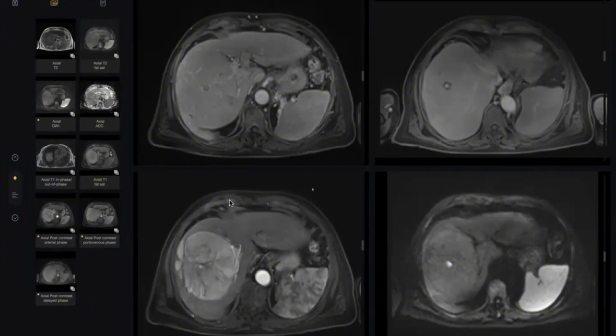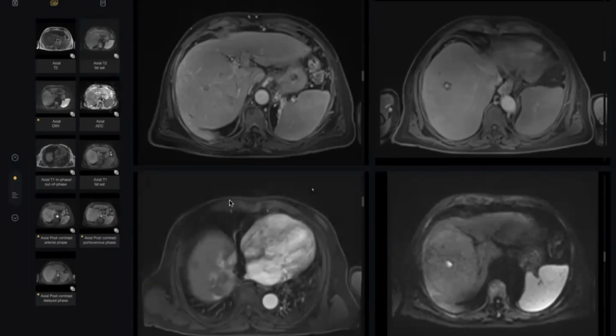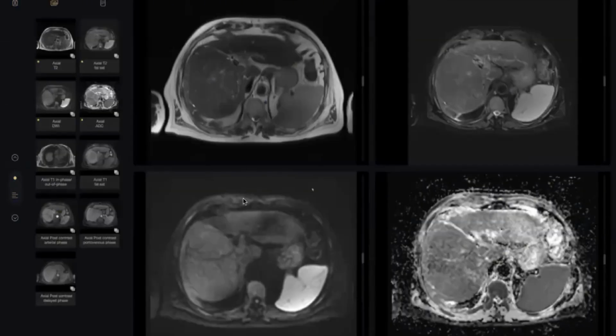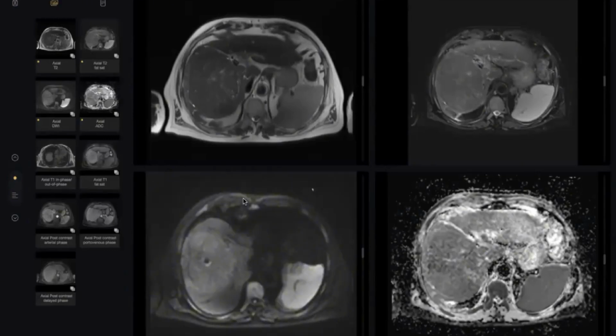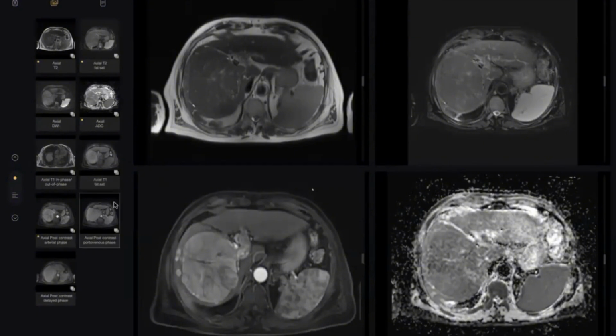Yeah, it is a very, very confusing case. Radiopaedia mentioned this is multicentric or multifocal hepatocellular carcinoma. In my opinion, it is better to put this case as a case of differentiation or differential diagnosis. The contrast is atypical, completely atypical. It should be a very important case.